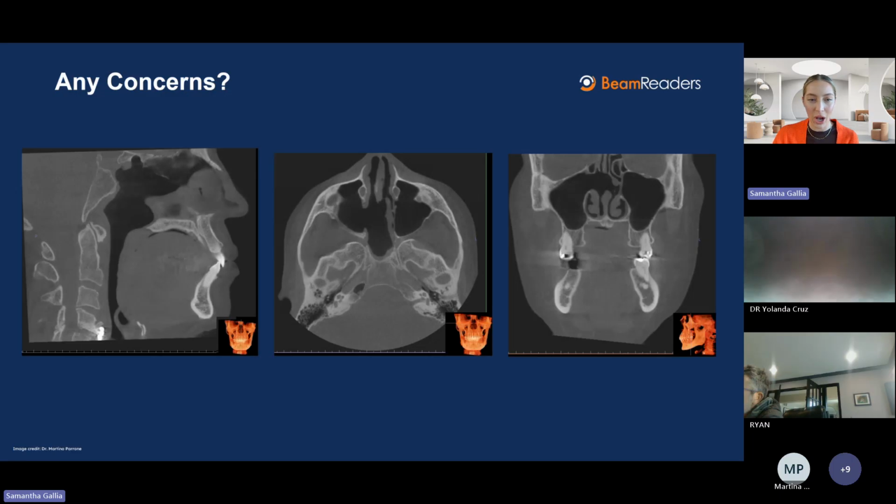All right, so here we've got an example. It's our first time diving into that, but I'm going to ask for some participation. Does anybody notice anything abnormal about these images? It can be anything. We'll give people a second to think about it. Feel free to just hop in if you want to chime in as well.